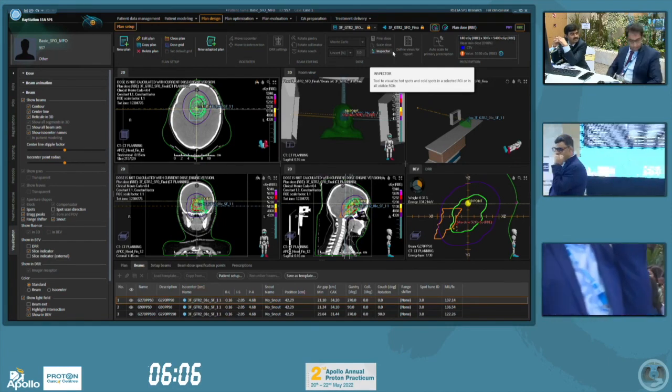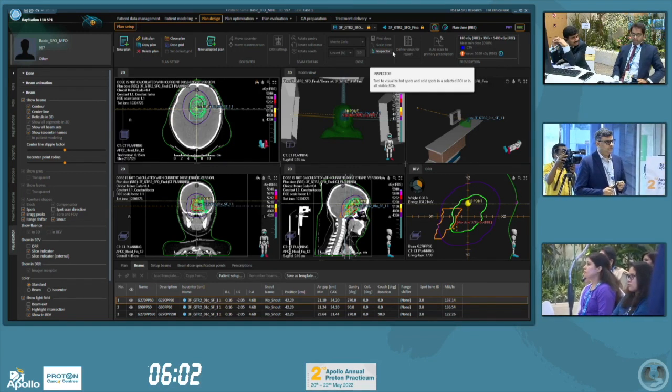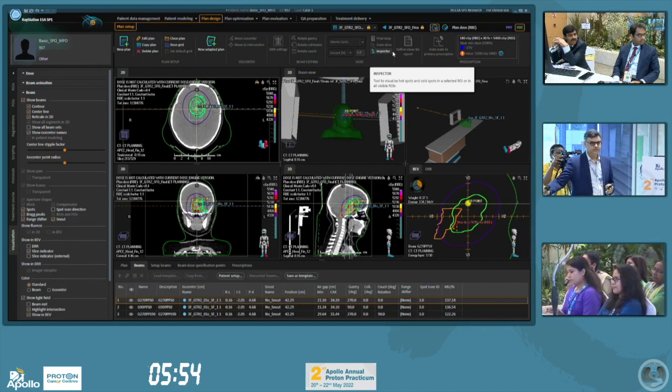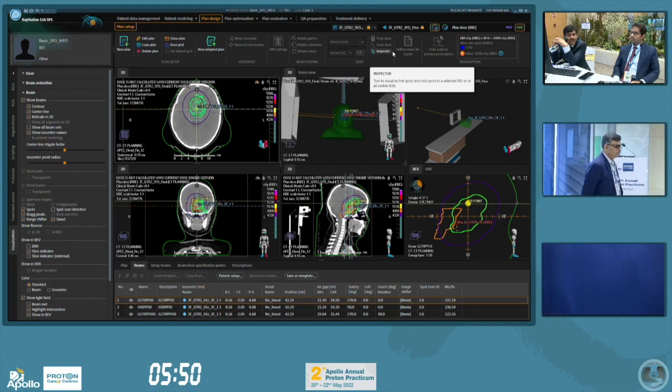Basic question. Once we do the optimization, compared to before optimization and after optimization, does the spot vary, or what does it actually vary? Does the energy vary, or is it just the contribution of the dose that varies? A little bit of clarity on that.